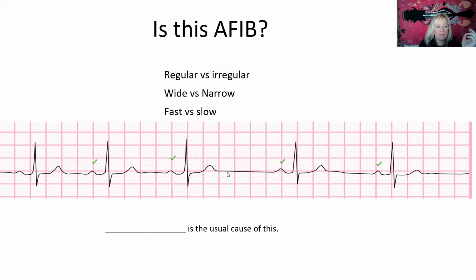Somebody asked a good question: are there pauses? Is this a sinus pause? That's actually a very high-level question and thought, because it could be a pause. But what you would need is a longer strip to say for sure, because a pause would just come and every other R to R would be regular.